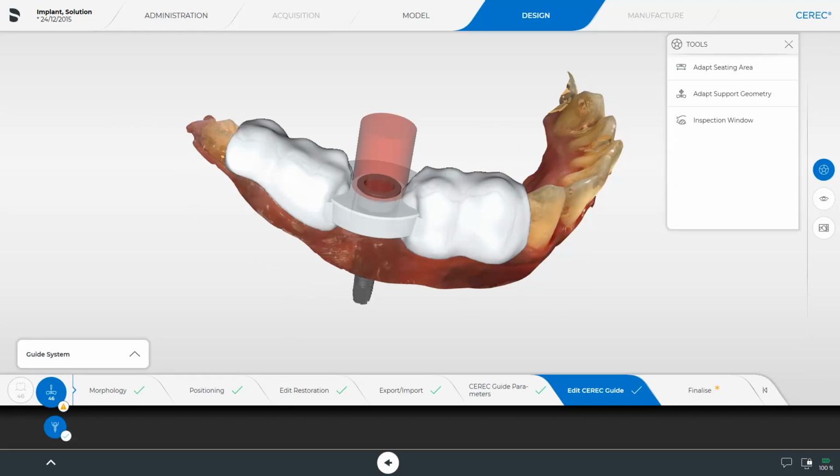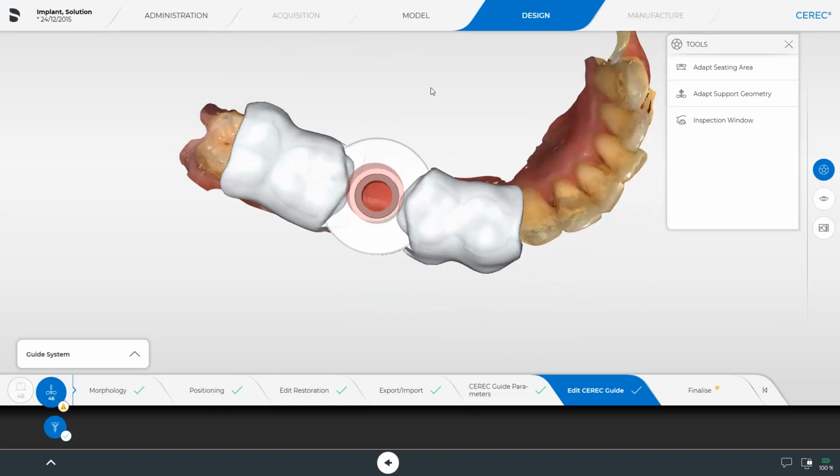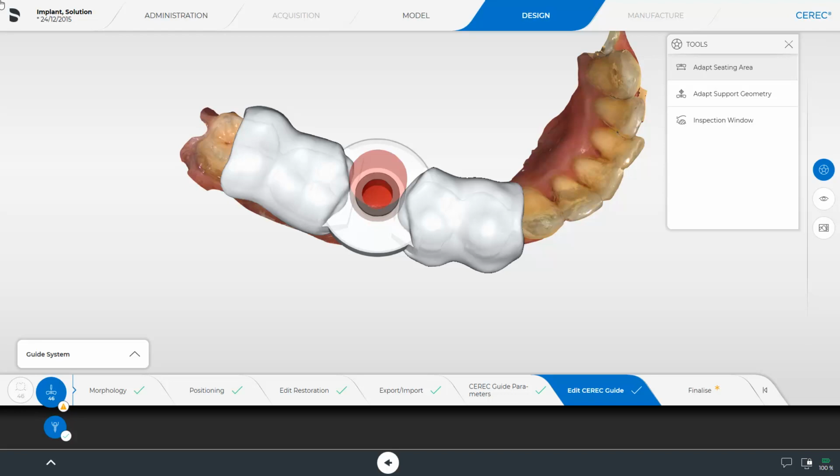The surgical guide includes 2 adjacent teeth, mesial and distal respectively if present. In this step, you have 3 tools at your disposal. First, we take a look at the proposal. The surgical guide sleeve is colored in red, as can be easily seen. Because this is a warning indicating a narrow situation, we will come back to it later in the video.